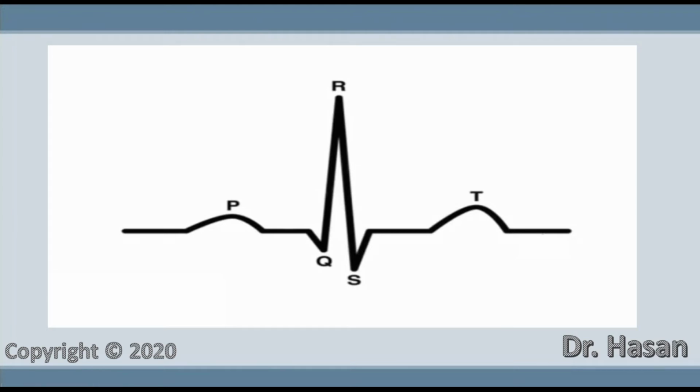In the ECG, there is also a QRS complex, which includes 3 waves: Q wave, R wave, and S wave. Why was it joined in the complex? This becomes clear when you notice that the QRS waves are not separated by an isoline. They go into each other and are separated by isolines only from the P and T wave.